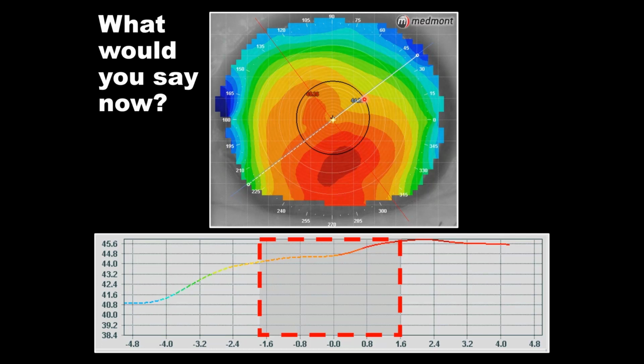So clearly that should create some aberration for the patient, some reduced quality of vision. Maybe this patient can still get 6/6 vision, but it would be expected that this tilt in the power of the eye would hinder the patient from being able to achieve, say, better than 6/6 vision.